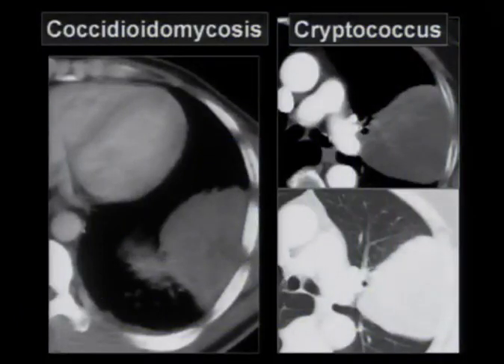So, a couple of cases of fungus causing large masses in the lung. Is there anything specific about this? Absolutely not. A lot of what you're seeing here really depends on where you practice. San Francisco is kind of in the tail end of the coccidioidomycosis belt, so you'll see cocci now and again around here, and you have to think about that, and you have to modify your practice according to where you work.